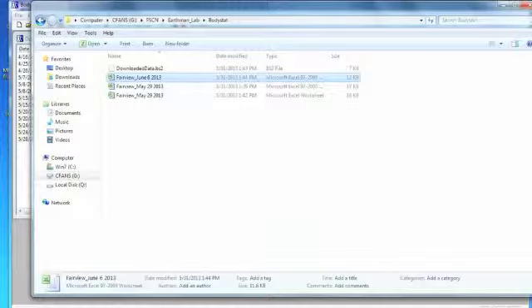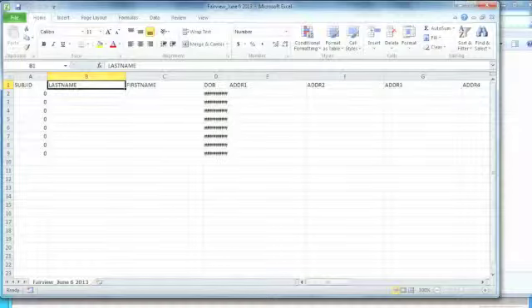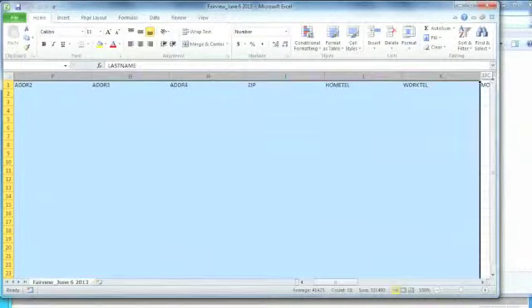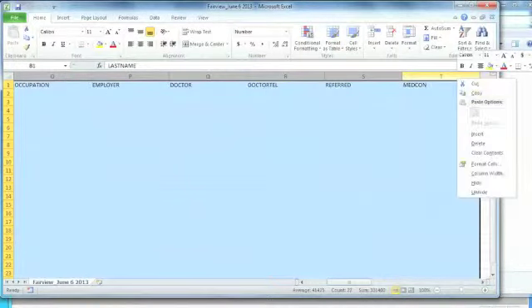I'm going to do the same thing where I delete columns B through T and then input the subject ID numbers corresponding to each of the tests. So it's the exact same procedure, but now with a new set of data.